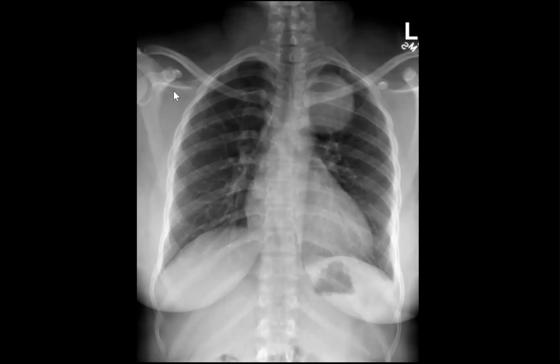Very good, but rearrange the differential diagnosis. Very good description. Superior mediastinal mass projected over the left upper lung zone, having well-defined lateral border, medial border merged with the mediastinum or broad-based to the mediastinum. Its upper border is well-defined above the clavicle, so not silhouetted, so negative cervicothoracic sign.